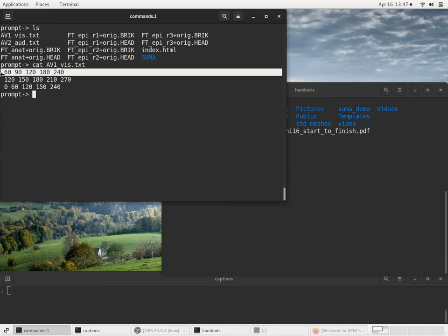And we've already subtracted those 4 seconds from all of these event times. So at the scanner, maybe if you include the 4 seconds from pre-steady state, the actual stimulus events were at 64 seconds, 94 seconds, 124, etc. But then we subtracted 4 seconds from all of the stimulus events to account for the removal of the 2 pre-steady state volumes.